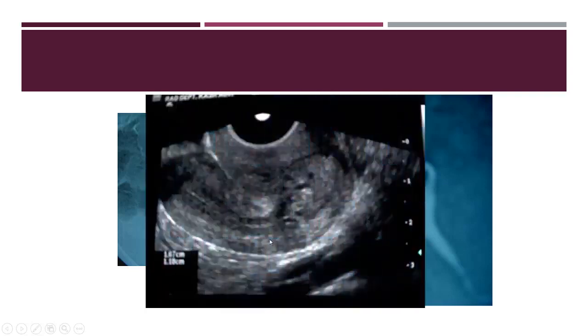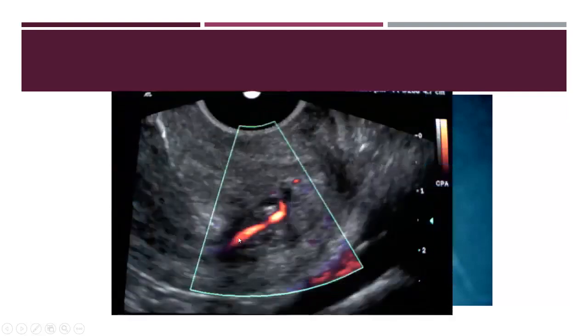In this case, they told me that the contrast is coming out and they could not do the hysterosalpingography. Here, we put a very narrow dilator which can opacify the cavity, and on doing ultrasound, there was a large cervical polyp. This was causing obstruction to the passage of contrast, with the typical vascular pedicle sign. So this is a cervical polyp causing a capacious cervix and malposition of the uterus.